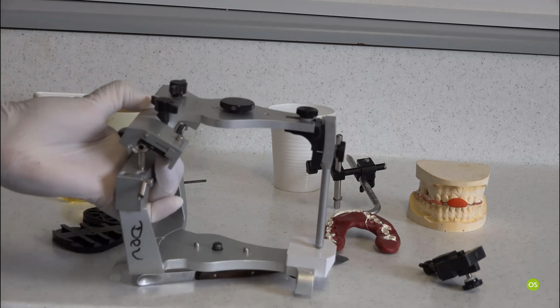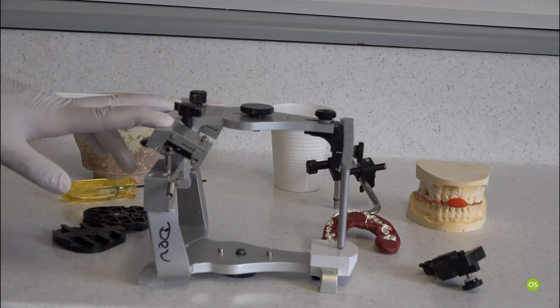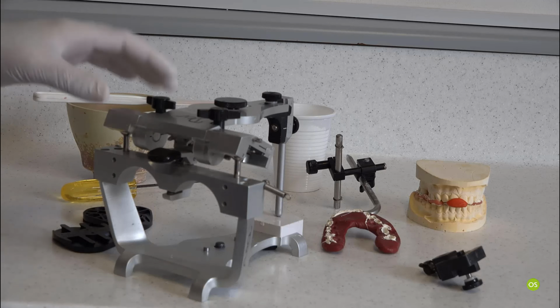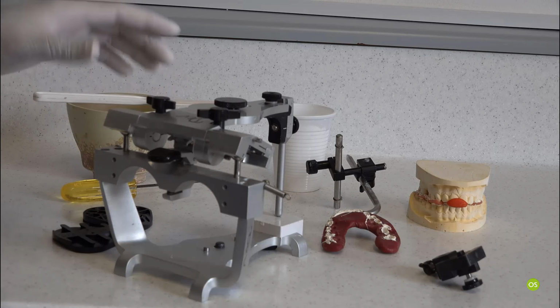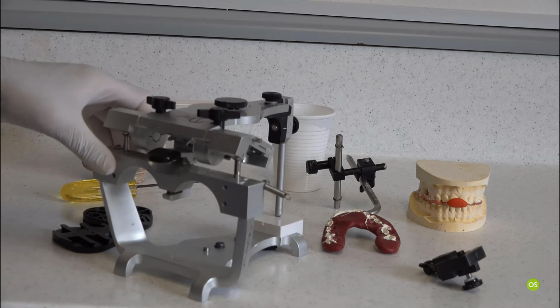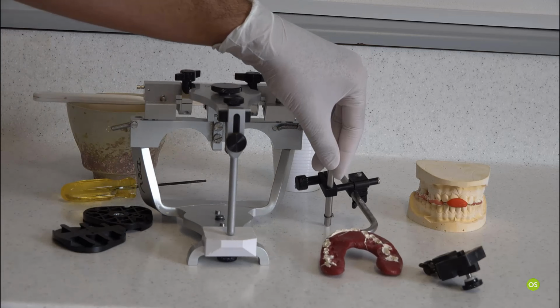To be honest, as we discussed before, I do not adjust the settings too much or too often. I would say rarely I would adjust the settings. I would keep the settings to the minimum, and we will go through within the lectures what settings I keep regarding condyle inclination, immediate side shift, progressive side shift. However, if you get the articulator where all the settings are done in Denar, then you will still be fine, as far as you have some sort of articulator which you can relate your Facebow to.